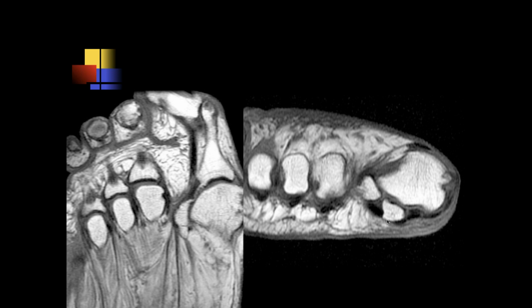So here there is lateral subluxation of the sesamoids. Yeah, it looks more chronic to me, but I'm not sure if they have any recent trauma. So this is chronic, and with chronic injuries to this area, typically we see marked atrophy of the muscles. This is someone who's really not ambulating well right now, but this is really a chronic tear of the sesamoid phalangeal ligament on the medial side, and then lateral subluxation of both of the sesamoid bones. That's a common finding in older people.